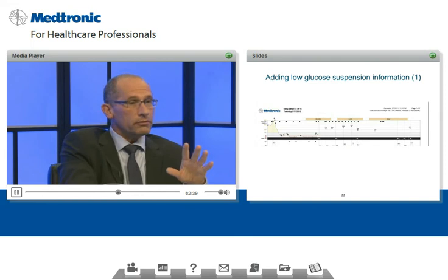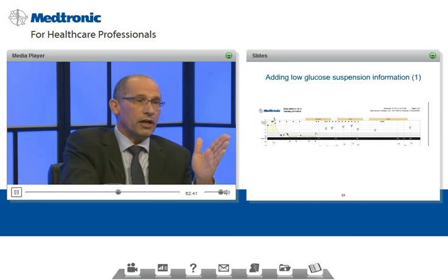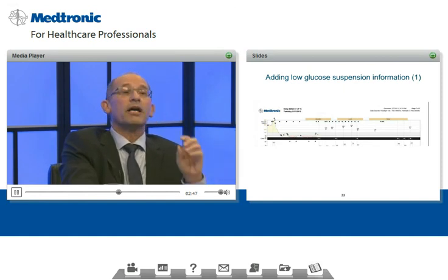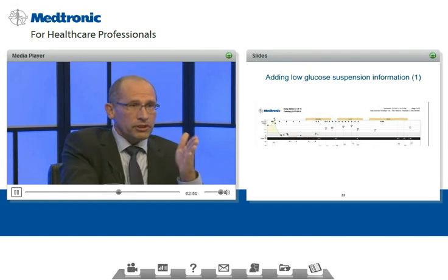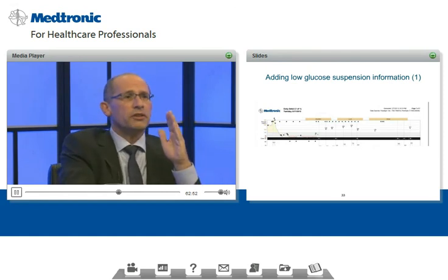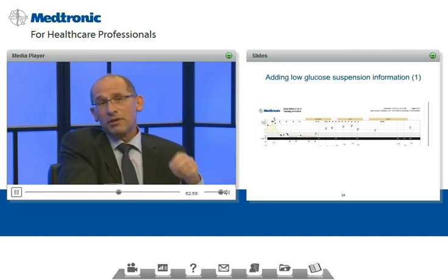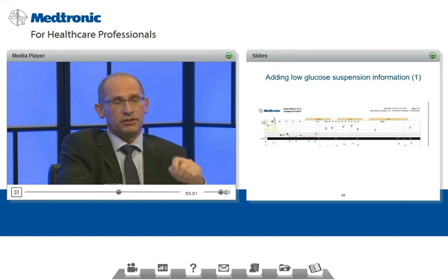He went into coma, or slept through the alarms, and in the morning, about 4 hours later, he came out of the hypoglycemia. Somehow, and you don't see it here because there's some mistake, the low glucose suspension kicked in.